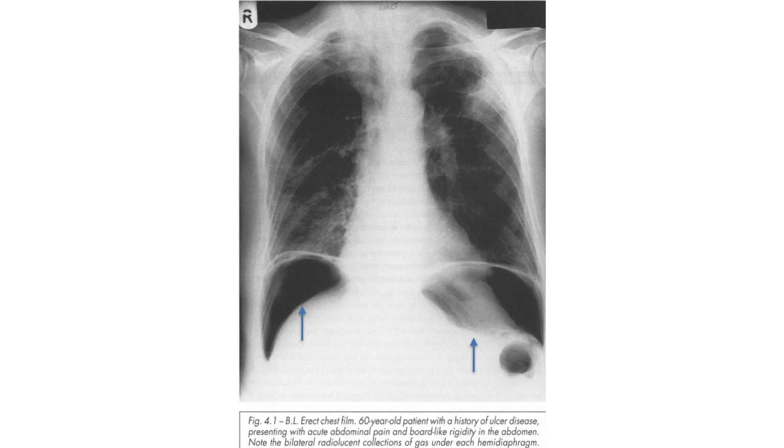Now, pneumoperitoneum is easy to confuse with other pathologies. So you have to make a differential with other pathologies. It's very important because if you say it is pneumoperitoneum and it's not, you will send the patient to theater in vain. They want to cut the patient, that's the issue. For pneumoperitoneum you have to be very sure, because the only solution for the patient is going to the theater.